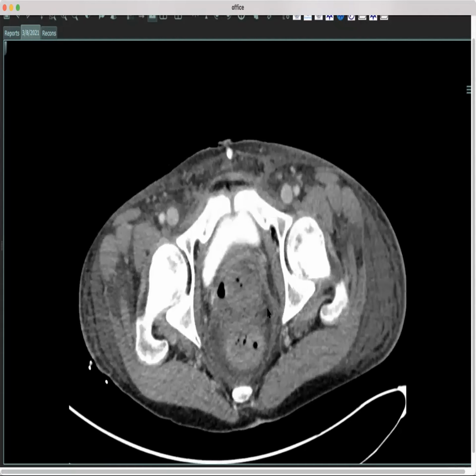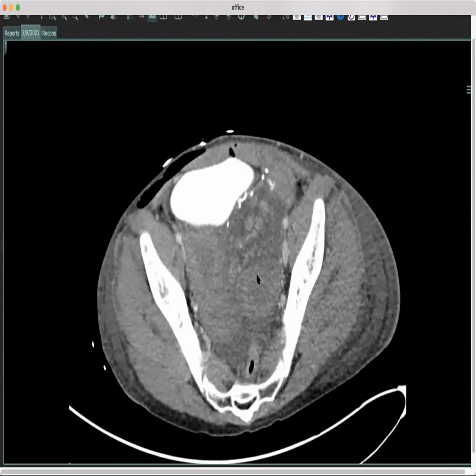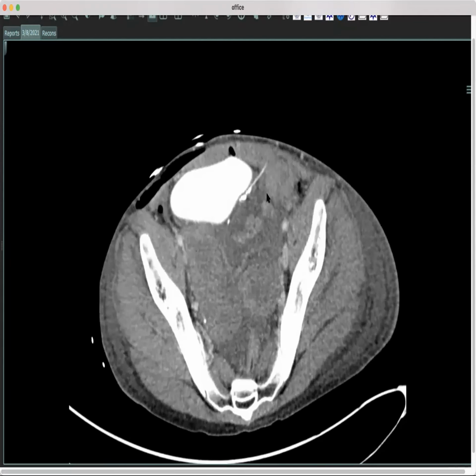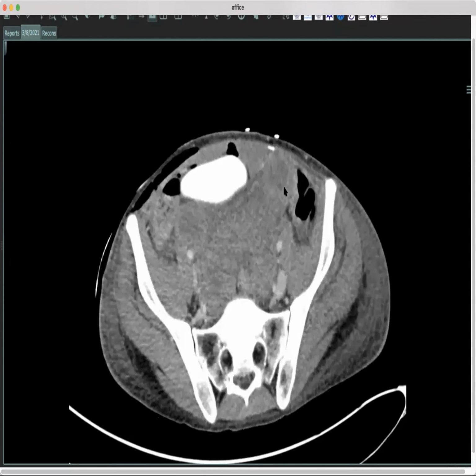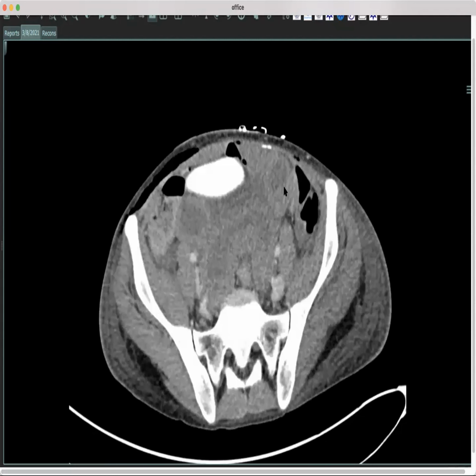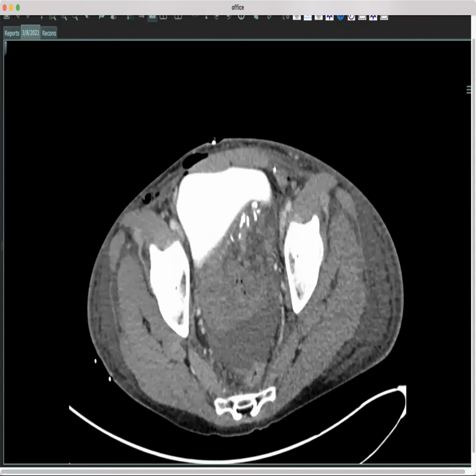And that makes sense with what we're seeing on the CT, I think, right? This loop is way longer than 20 centimeters, if you ask me. It comes way up here and loops down and around, and you can see the anastomosis over to the epigastric. So I don't know enough about this to know how often they take X centimeters or not, but for whatever reason, in this case, they took a pretty long segment. I'm imagining that they put 20 centimeters down below, but then the other 40 centimeters that was also attached to that same mesentery became ischemic too.